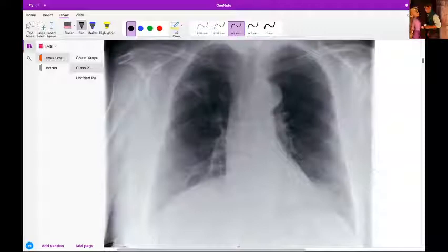What Bats is saying, right and left lower lobe, that's actually breast tissue. That's increased density because of breast tissue, so that's not the lesion. There's only one left now. All other options are exhausted. I thought Toby would be able to see it.